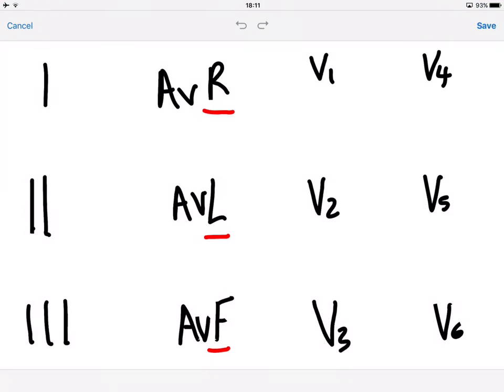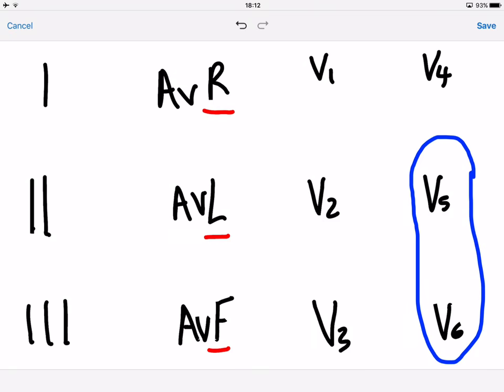So a few tips and tricks which will tell you which coronary artery is affected when you see, for example, an ST depression or an ST elevation. So the first thing I like to do, once I've drawn out my leads 1 to my V6, is put a circle around my V5 and my V6. I like to put a circle around V1 and V2.